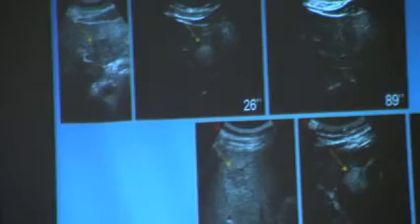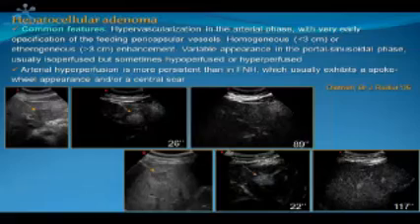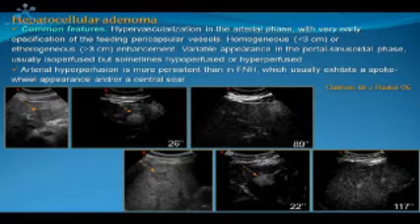Then the adenoma will show a more variable appearance, but this too is a hypervascularized lesion in the arterial phase, being homogeneous or heterogeneous mostly depending on the size, and the appearance in the portal and late phase is more variable.